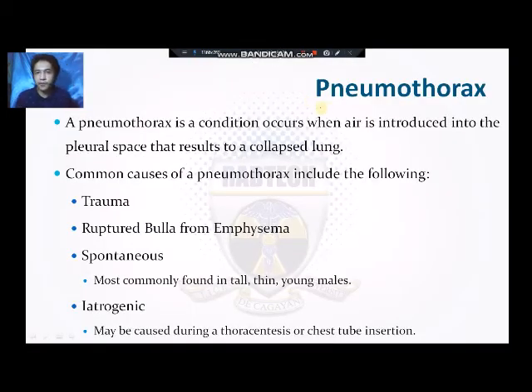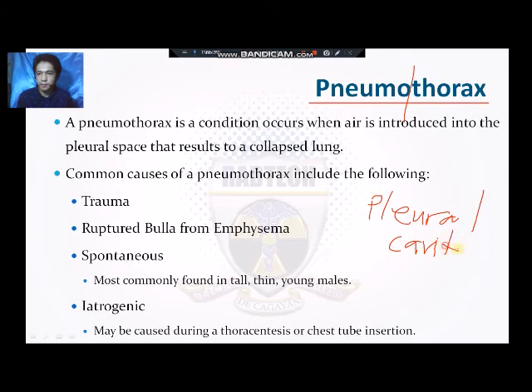So next we have pneumothorax. Pneumo means air, and thorax refers to the thoracic cavity, or also known as our pleural space, the pleural cavity. Okay, so for the pleural cavity, try to draw a lung. They will try to draw a lung there.